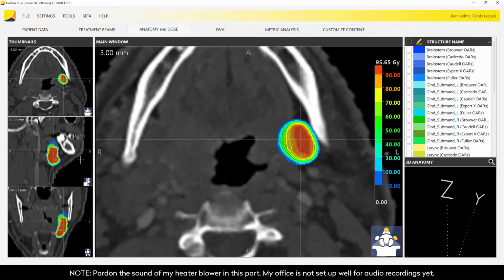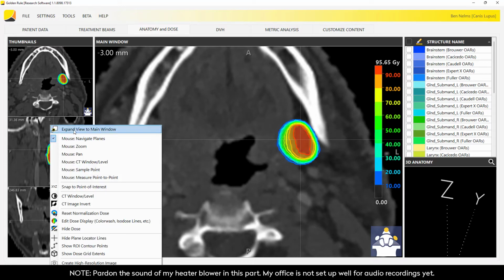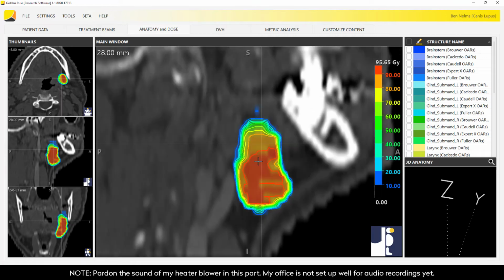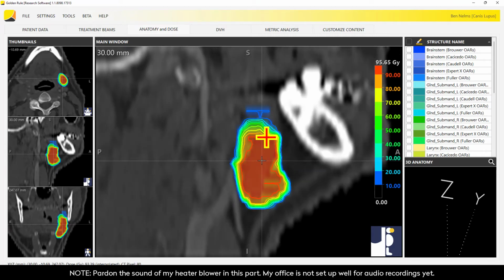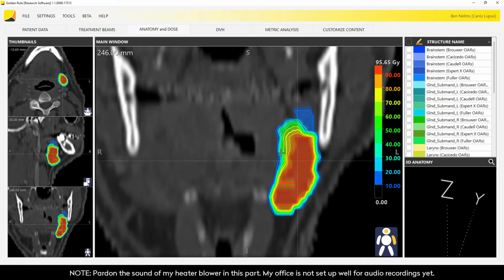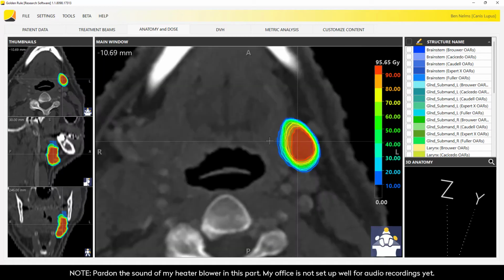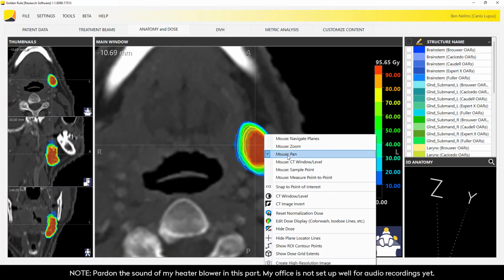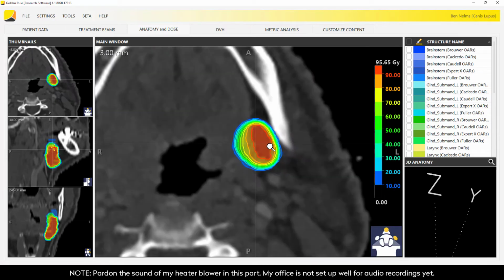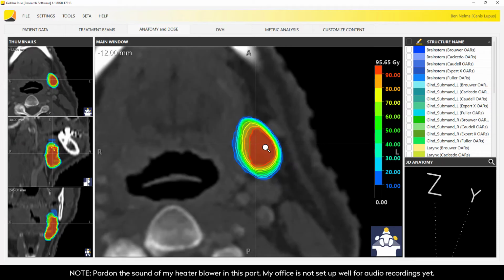Well, now this seems to be more consistent than the last one. This looks quite consistent. Well, relatively consistent. If we look at the coronal here, so this is the left submandibular gland. That's very interesting. This may be competing to be one of the more consistent structures. Let's kind of do a flyby. This is the population. Let's turn the experts on.